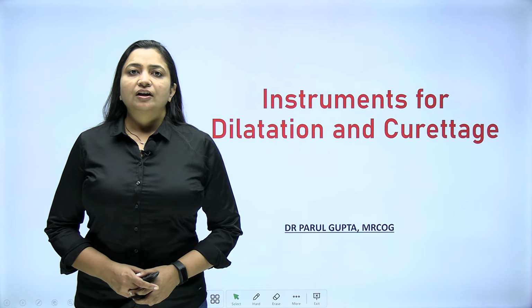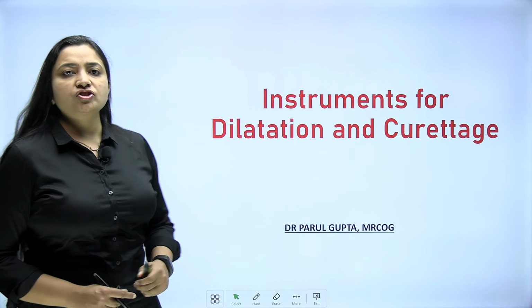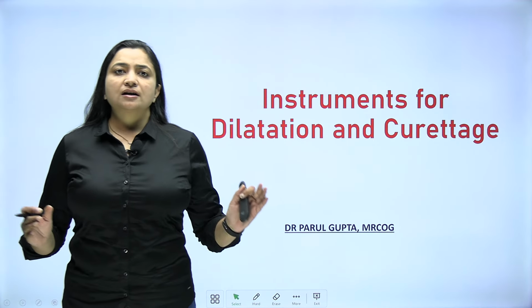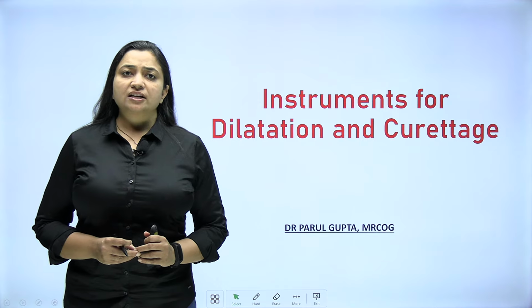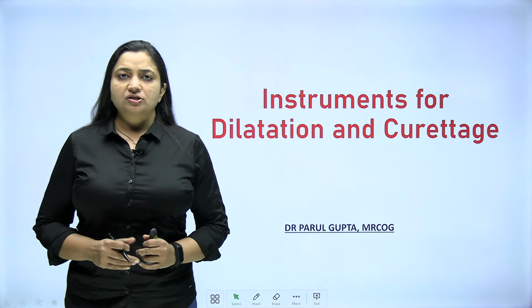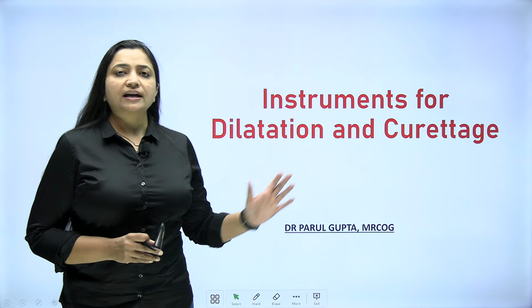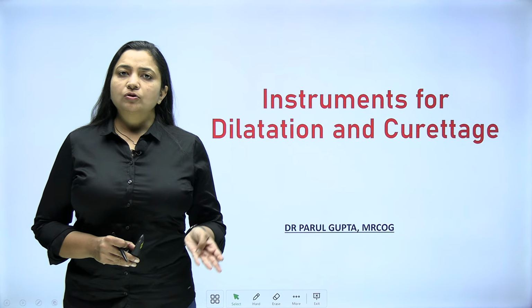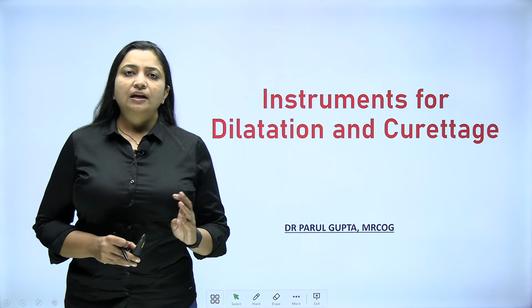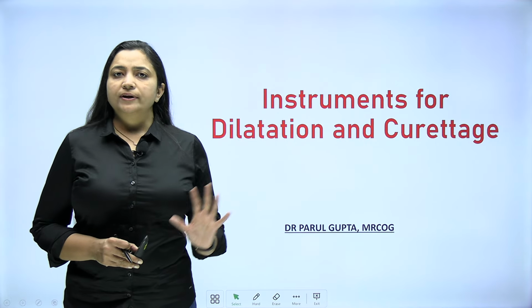Hello everyone. Today we are talking about the instruments used for dilatation and curettage. This is the closing part of the instruments that are generally used in obstetrics and gynecology, more specifically in gynecology OPD, in small procedures. I have mentioned dilatation and curettage, but it could be dilatation and evacuation, it could be endometrial biopsy also, right? And some OPD instruments.